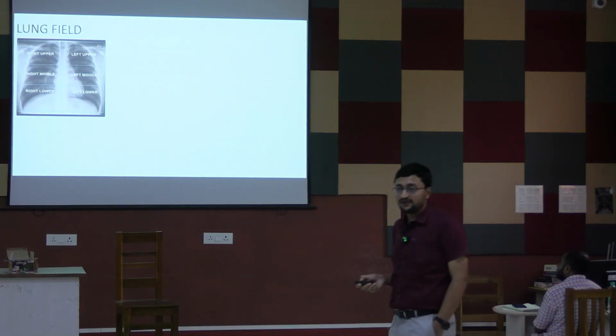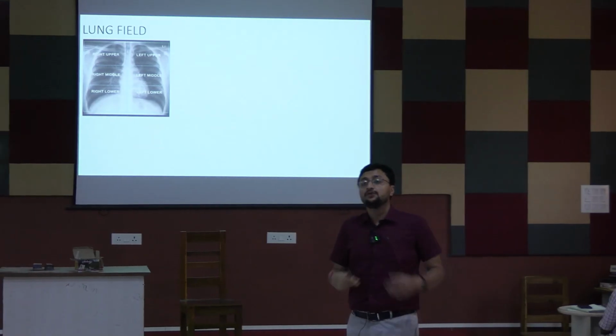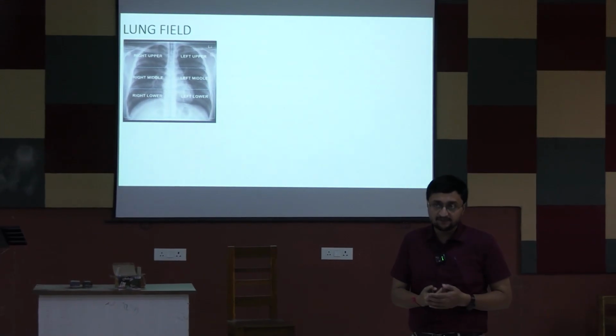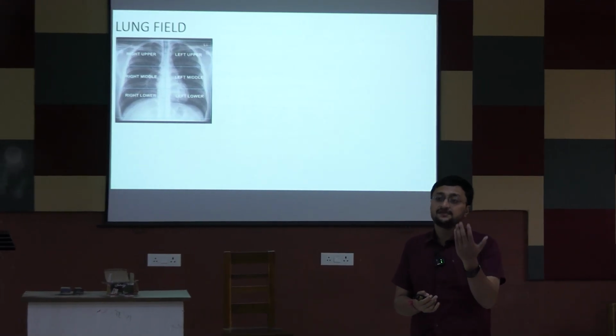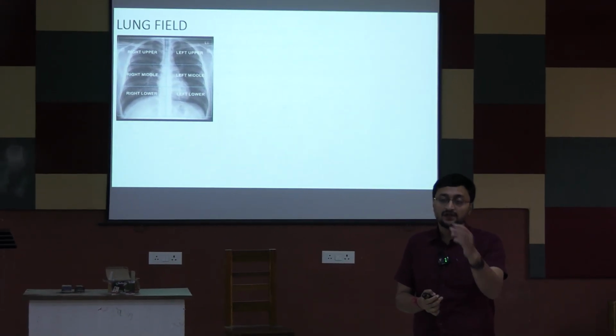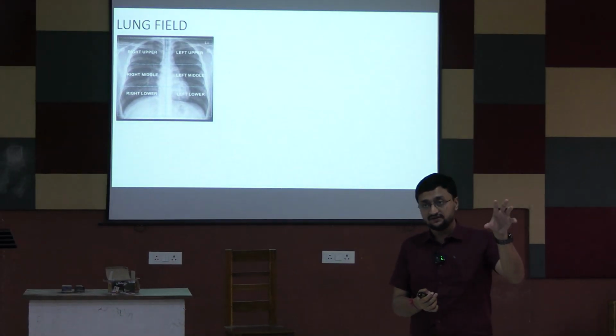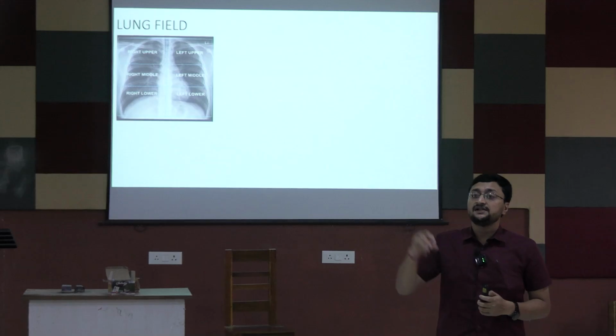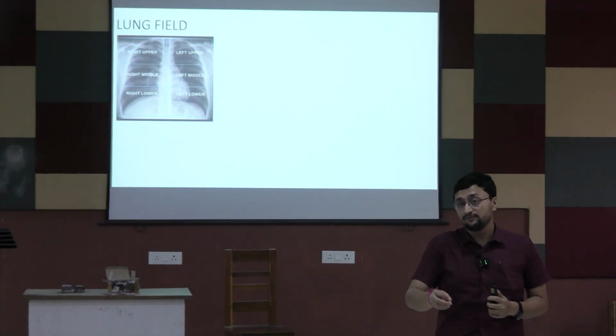And most importantly, when you describe an X-ray, suppose there is opacity at any area of the chest. Do not say right middle lobe or right upper lobe.